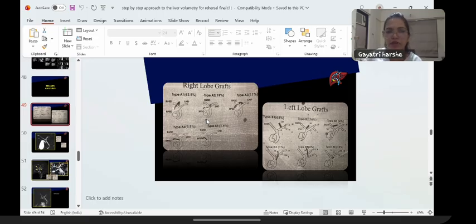Whether it arises from left or right doesn't matter, but the length remaining after the origin of the segment 4 artery will be the deciding factor. As I said, at least 7 to 8 millimeter of length they need to anastomose, and that should be extrahepatic. So an extrahepatic length of 8 to 9 millimeter they need for the anastomosis.